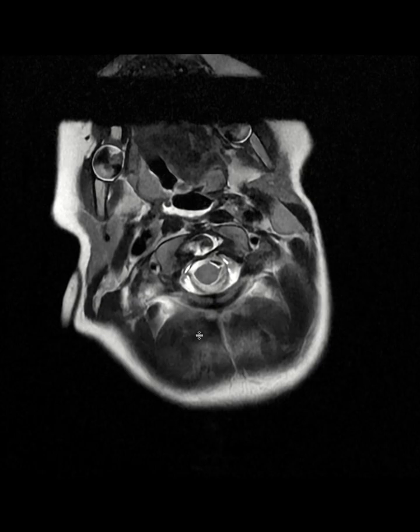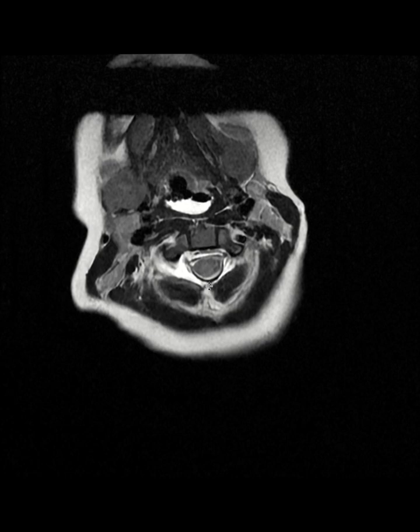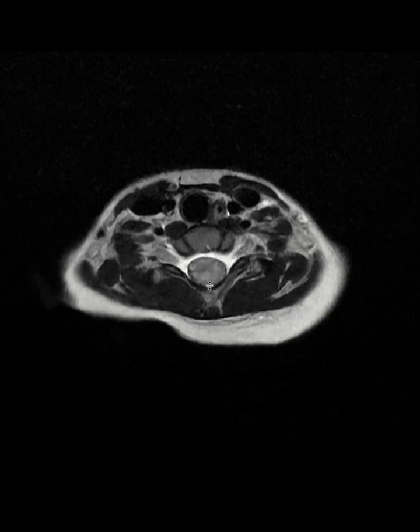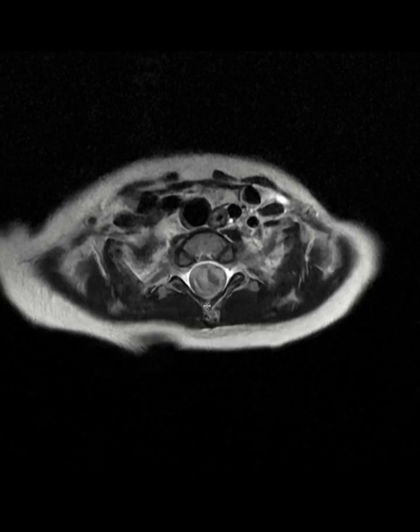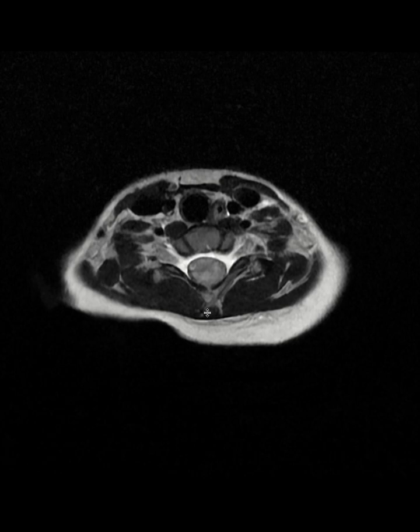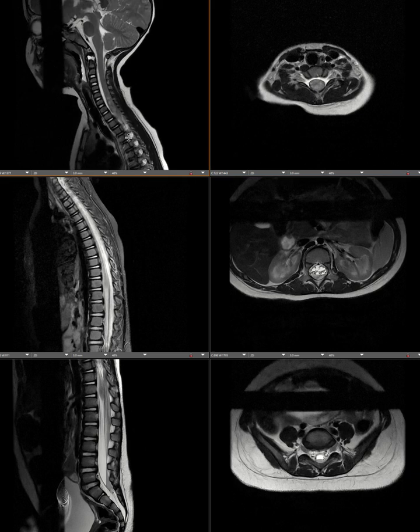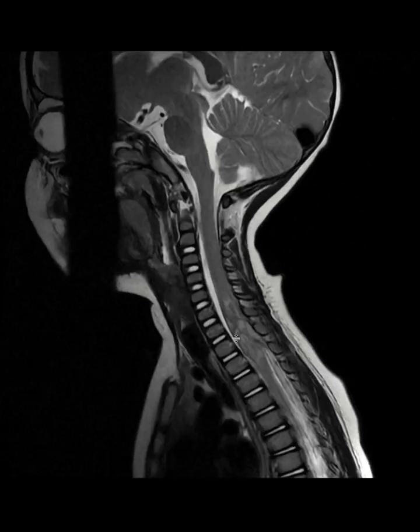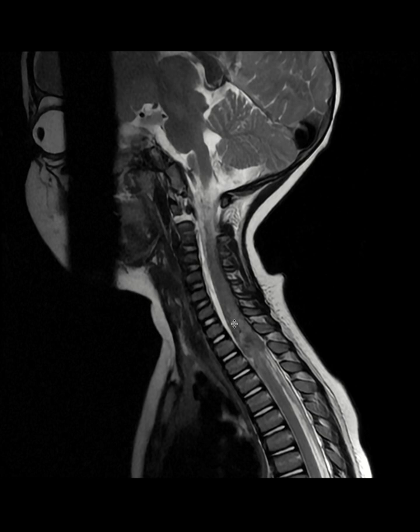If you look at the normal cord and then at the normal canal, suddenly you look at the canal and the diameter of the cord is just doubled and looks like it's filling the thecal sac entirely. So this is the spinal cord injury with almost avulsion and hematoma and hemorrhage, and part of it is actually transection of the cord as well, because you just see all hemorrhage into the substance of the spinal cord.